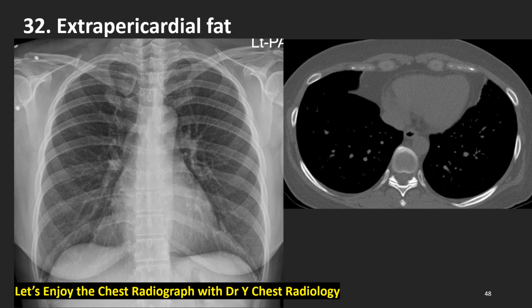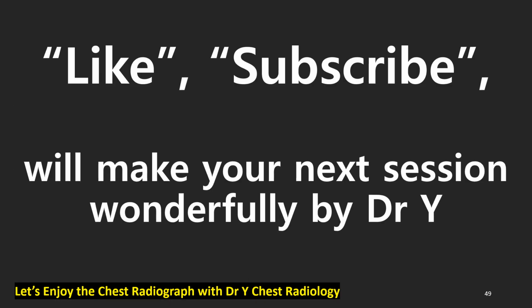This is the last slide of the images. Did you enjoy the scenic drive? Congratulations for your effort and your success. Now you are the maestro of the lung nodule and the pseudo nodules on the chest radiograph.